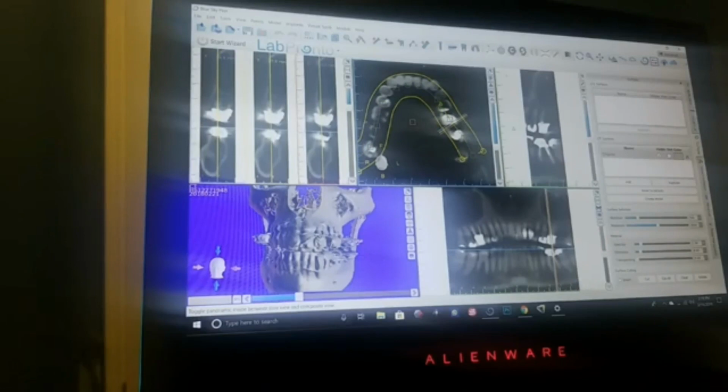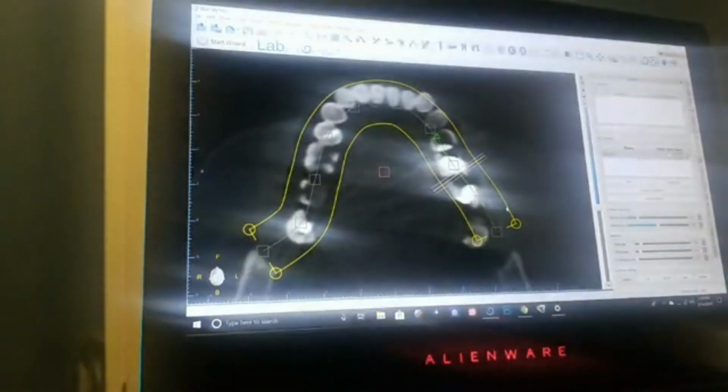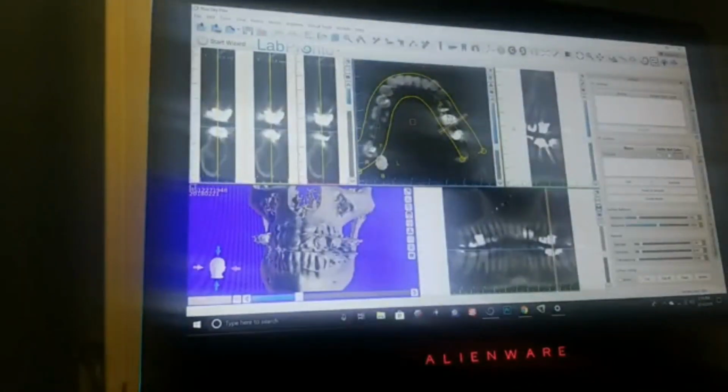I'm going to click up. Now take a look again. Now I have a highlighted outside, and inside it's not highlighted anymore, right? So when I come here, now you're looking at the true panoramic view. That means all the images that the CBCT has taken between these yellow lines have been placed on top of each other like a book, and you're looking at this image that way. But when you're changing it, you're only looking at one slice amongst many slices in a panoramic view.